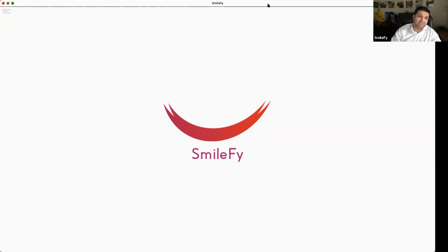I'm going to show you something that is very, very interesting. It is a case, and we're going to create a mock-up first, and then we're going to readjust the design over the prep. The whole workflow shows how important digital dentistry is, how important it is to create the digital projects, and during the project to see what part is missing for the best treatment planning.